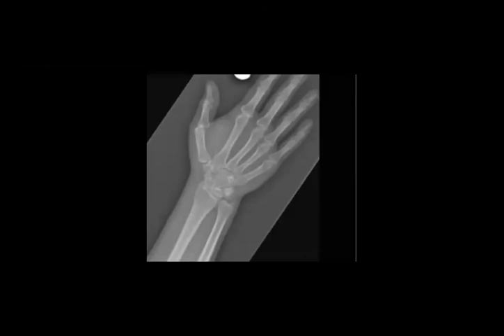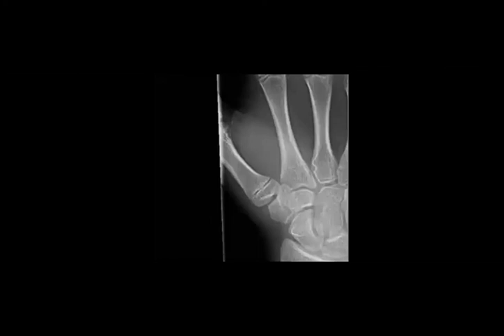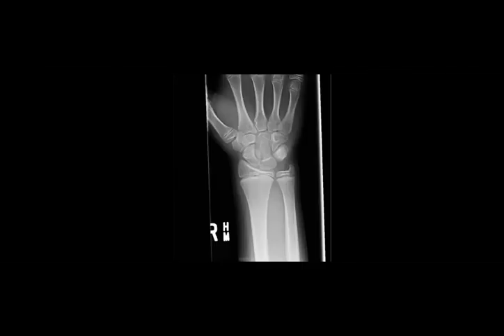Still difficult? Okay, so do you see this fracture? So it is, yeah. Okay, ulnar styloid fracture here. Okay. This one is similar, but... Trapezium fracture. Yeah, it is an ulnar styloid fracture again. You can see here, a very subtle fracture.